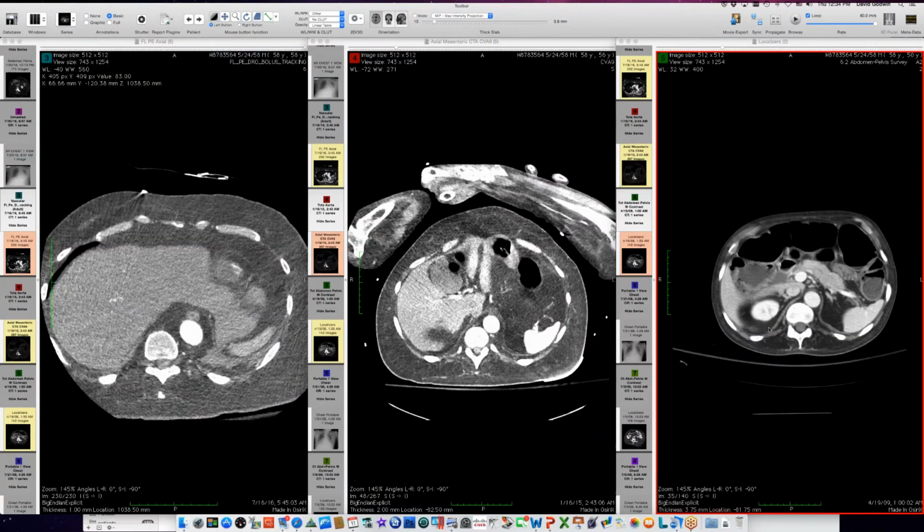So let's go back to 2009 here on the right, and you can see that he has decent thickness of the diaphragm muscle down here at the level of the crura. And then in 15, you can see that the crura is very ill-defined. There's some fatty replacement, just as there's fatty replacement in some of his paraspinal muscles back here.